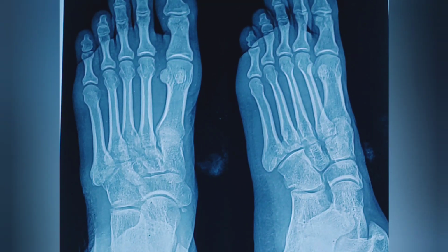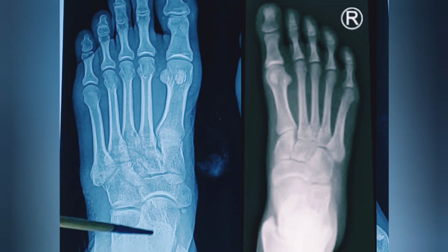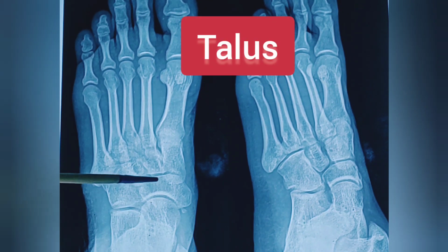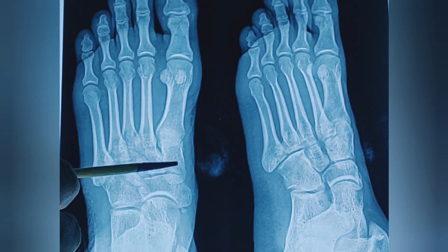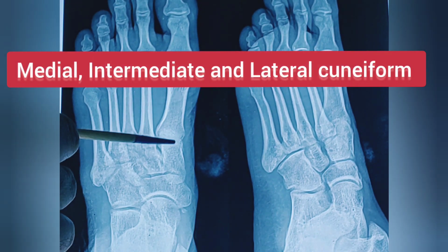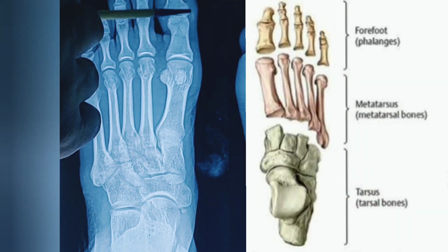In this plate we can see this is the anteroposterior view or dorsiplantar view. All these are tarsal bones. From proximal to distal they are calcaneum, then talus, then medially this is the great toe. So medially this is navicular, this is cuboid, and in front of navicular there are three cuneiforms: medial, intermediate and lateral cuneiform. And here the five metatarsal bones, starting from first, second, third, fourth, fifth, and all these are phalanges.